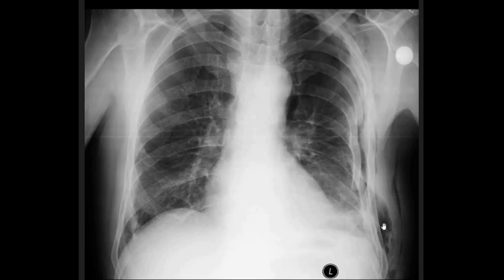Here it is normal, and we see here how there is some blackout of this whitish tissue. So this is a subcutaneous emphysema. If you would push with your hand on the skin, you will feel this. Once you feel this, you will never forget it. It is some kind of crackling feeling under the skin. So this is actually air in the subcutaneous skin, or subcutaneous emphysema.